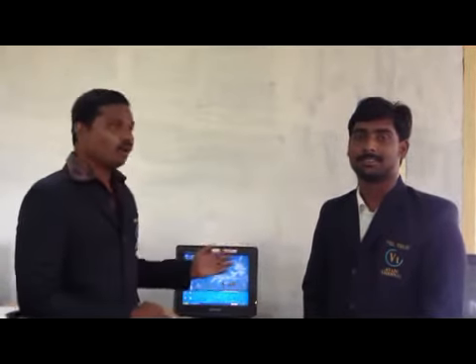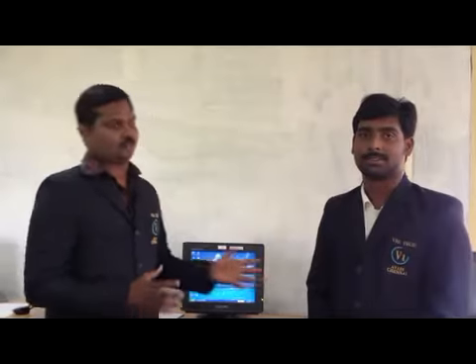And currently we are going to present a topic on an efficient and integrated approach for the detection of exudates and blood vessels in color fundus images, which is a final year project. Let's have a look at the project.